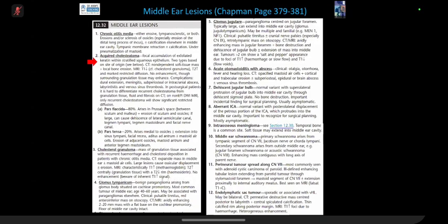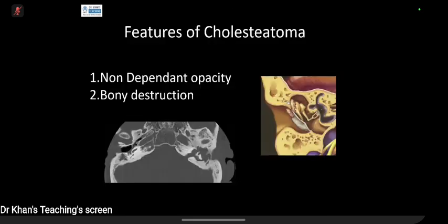This will not enhance or anything. Because this is always going to be a clinical chronic otitis media, rule out a cholesteatoma. On CT, we are not very good. About 50% of cholesteatomas can be picked up.